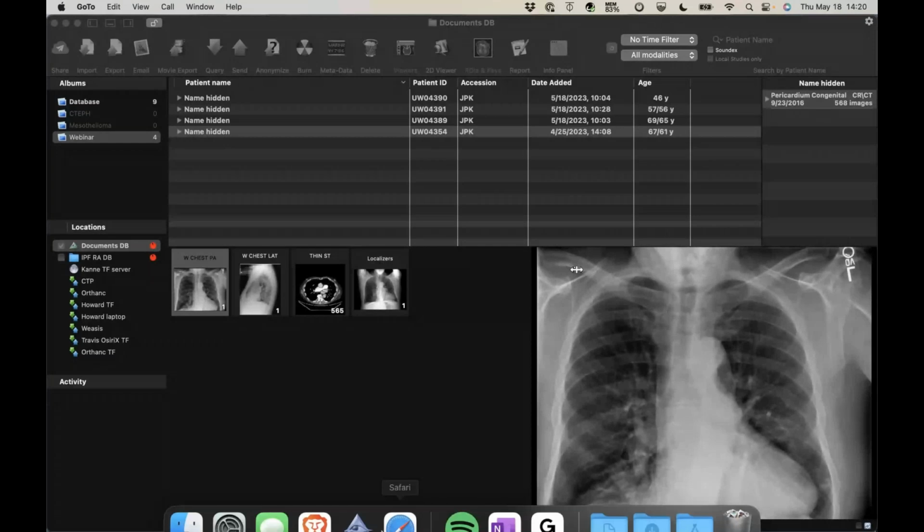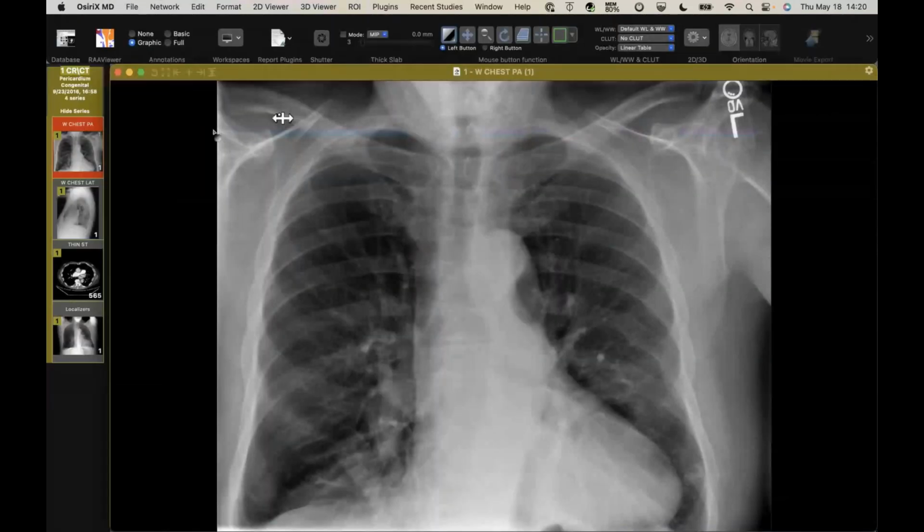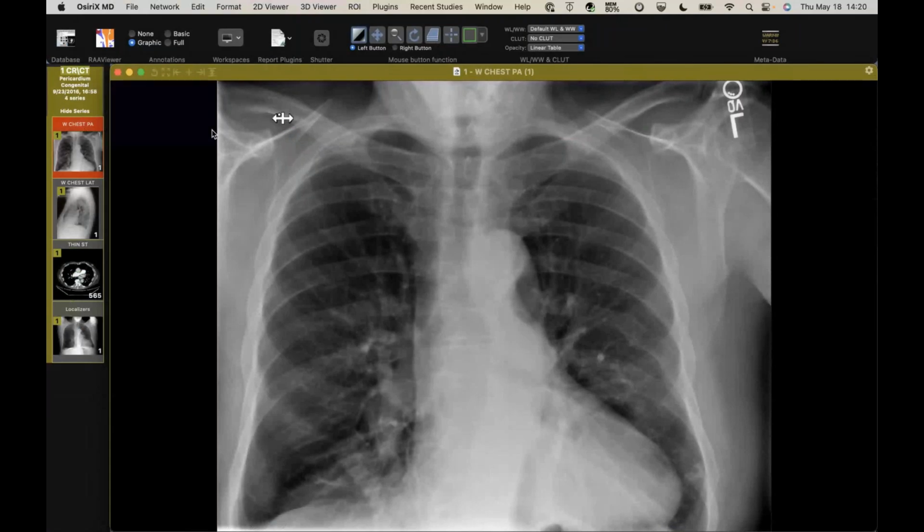All right, so we'll start with this case, and I apologize if I've shown this one before, but this was an incidental finding I came across. This is the best radiograph I could find. Unfortunately, they clipped the bases, but I just want to point out that the apex of the heart is a little bit uplifted, and it looks like there's some leftward shift of the heart. We don't see the right heart border very well over midline. You can see the hilum is over the spinous interface a little bit there.